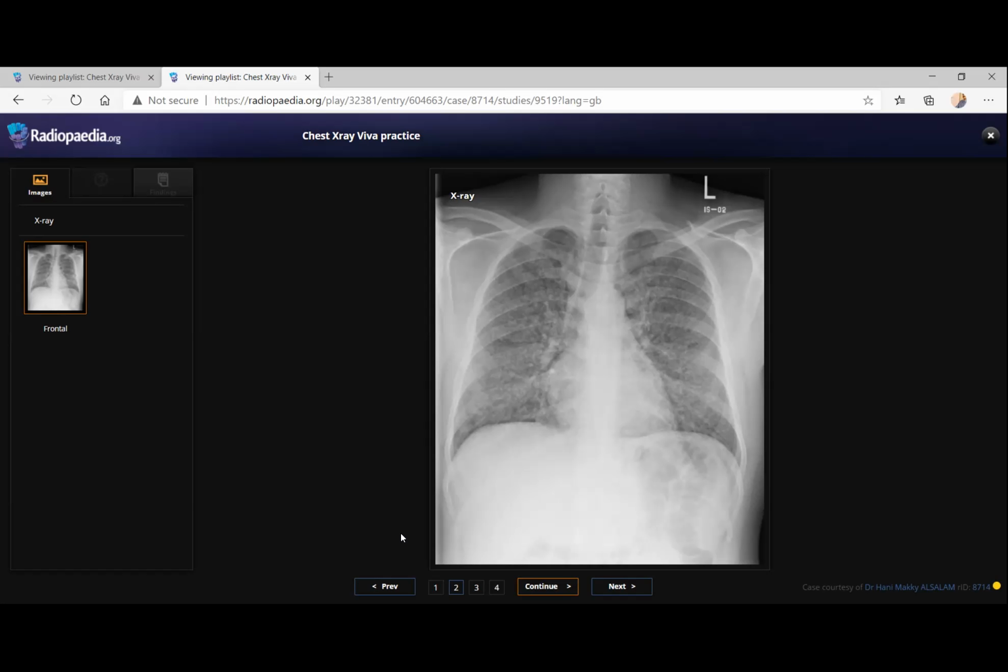What are the differentials before going to the CT? Yes. So my differentials in this case would be, since it's a male patient, I would like to ask if he's a smoker. Might be a case of Langerhans cell histiocytosis, or I would like to exclude any hypersensitivity pneumonitis if this patient is being exposed to any allergens, something like in his occupation.